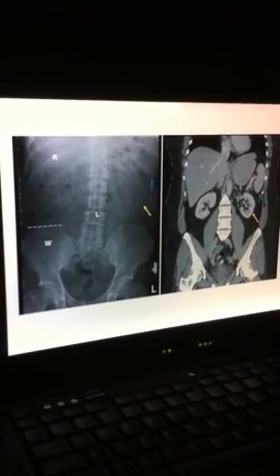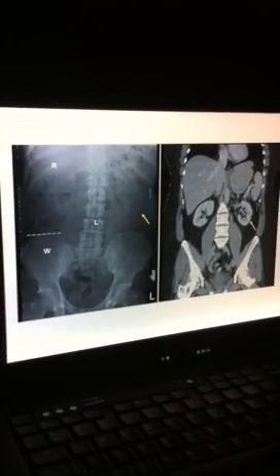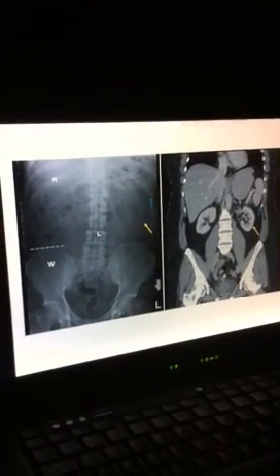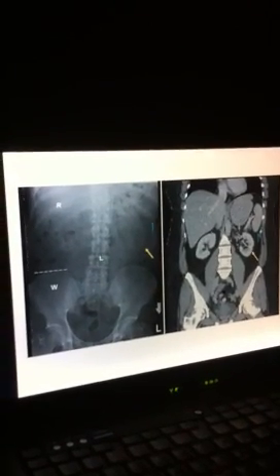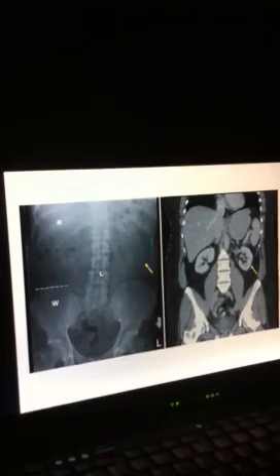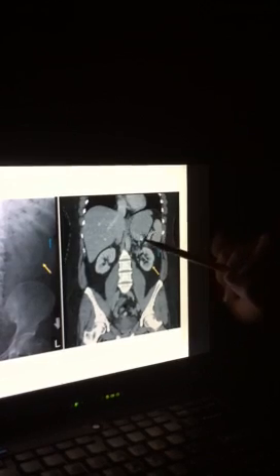Okay. Sorry, this is another KUB, just showing you where you are on the CT. So this is the corresponding CT. It's at a different level, a different view, so you can see different things than you could on the transverse slices. This is a vertical slice. So you can see this structure right here. The liver, yep, not this one.